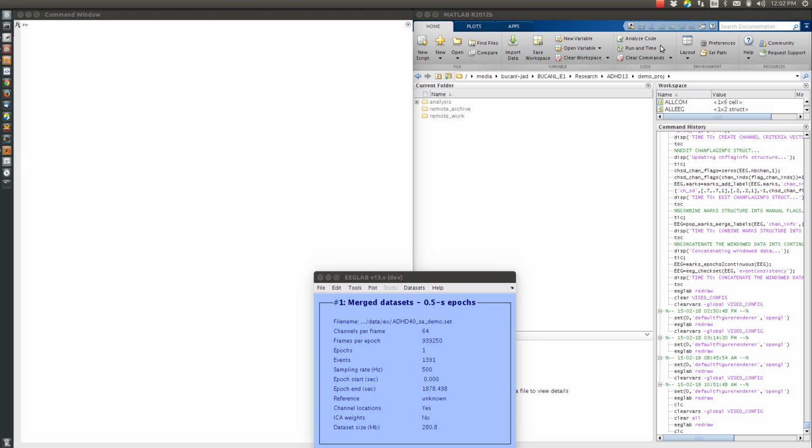Basically, the environment that I'm working in is a local instance of MATLAB 2012B on a System 76 laptop out of the box with Linux Ubuntu 14.04, and then a couple of software packages installed like FreeSSHFS and Meld. On the cluster side, there's Octave 3.8.1, which will be running the MATLAB scripts, as well as a compiled version of Amica 14 to be executed as MPI across cores. And this demonstration is really just about how to execute these procedures efficiently from the graphical user interface of EEGLAB.